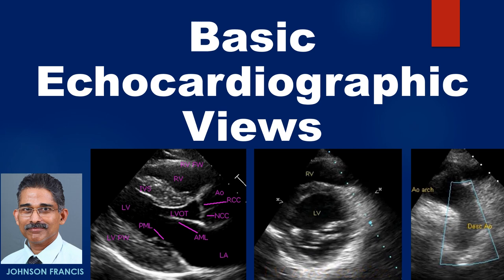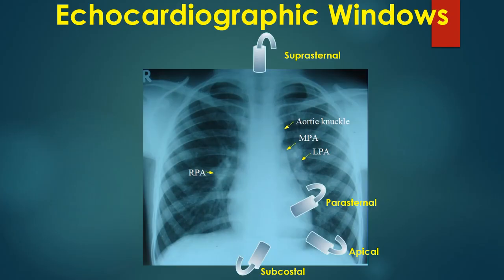Discussion on basic echocardiographic views. Echocardiography is now not restricted to the echocardiographic laboratory. It is used in the emergency department, at the bedside, in the intensive care unit, as well as in the operating room. Hence, a basic knowledge is needed for all physicians and paramedics.